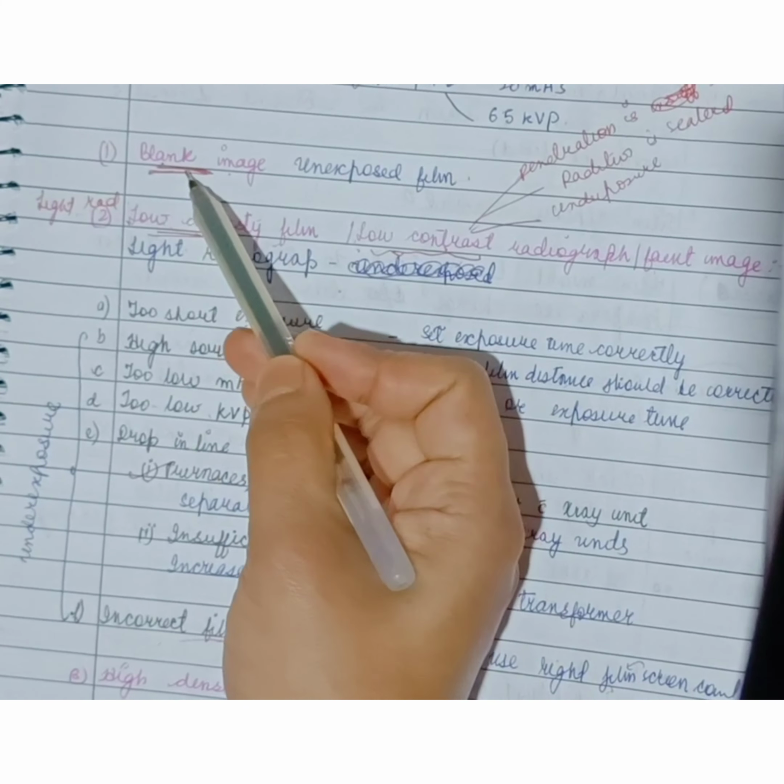When we expose the film, then we have to process it. We put it in the developer solution, then in the water, then in the fixer. So there can be a sudden temperature change when we put it in the developer. So how do we prevent it? We have to maintain the temperature. For example, in cold climatic conditions, we have to preheat the developer, and then we can put the film inside the developer. Another processing error is black spot or patches found on the film.